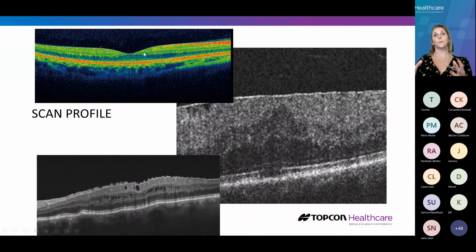Now, also important to point out, sometimes you may be visualizing OCTs in color. Typically these days they tend to be in black and white, but you may even get them in reverse, depending on the OCT device you're using and depending on how the clinic is interpreting and using that software. So in this top box, we can see we do have a normal profile. We can see our posterior hyaloid layer and we can see a vitreous structure, but we've got a normal profile for that patient.